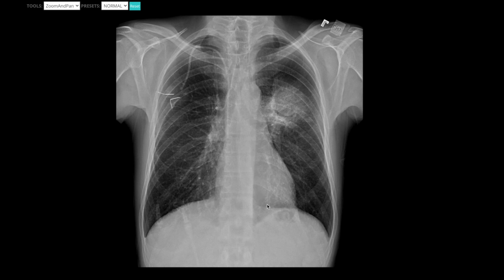The next thing you want to do is try your best to look at the vertebral bodies, and you play with the window to see if there's any compression fracture. What they'll look like is you will have lost height between the superior and inferior end plates. They'll just be more compressed compared to the rest. So those are subtle to pick up on the PA or AP view, but those are things you're going to want to look out for.